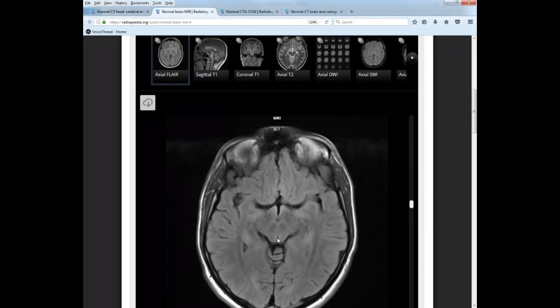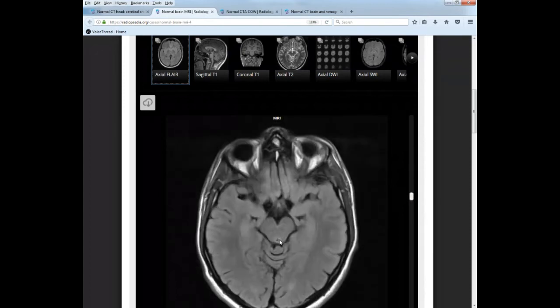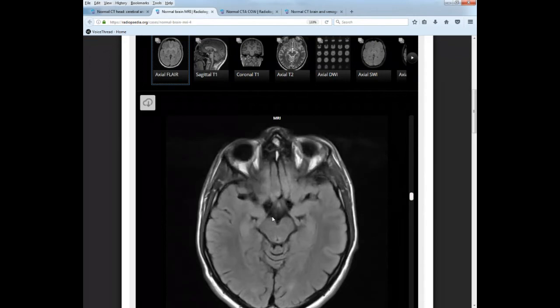Cerebral aqueduct right there. So if I keep going down, what am I going to hit? 4th ventricle, okay? So there's your aqueduct of Sylvius right there, all right? What are these two ear-like structures of my Mickey Mouse, my eyes? These are the peduncles, the cerebral peduncles, okay? Right there. So when you get to this level, you know that the cerebral peduncles are here and here, and the cerebral aqueduct, or aqueduct of Sylvius.